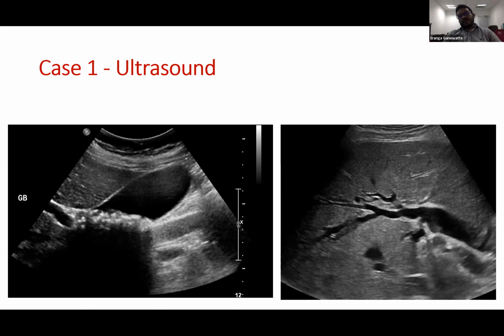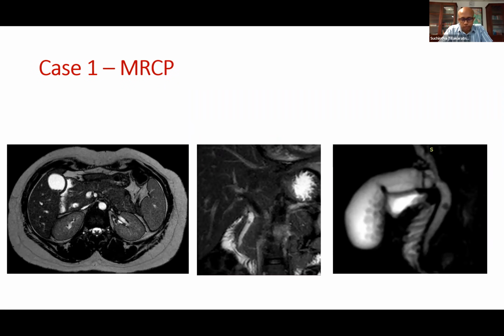So in this case, on ultrasound, you would say there is dilatation, but you cannot see a gallstone. Whether it has passed, because of the passage and edema you still have the residual dilatation, but obviously there is a gallstone. So some gallstone has passed, or there may be a distally lodged gallstone. In this scenario, I think any clinician would be requesting at least a CT scan as cross-sectional imaging if facilities are available. Actually, the patient underwent only an MRCP scan, that is probably based on the logistics.